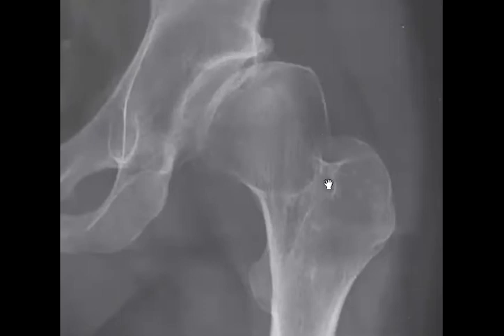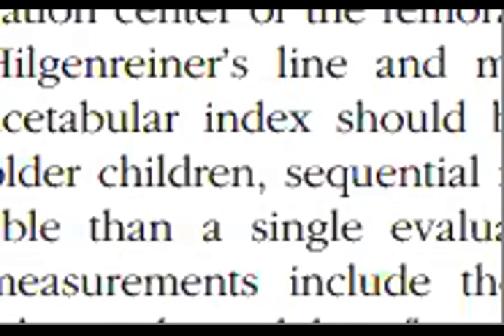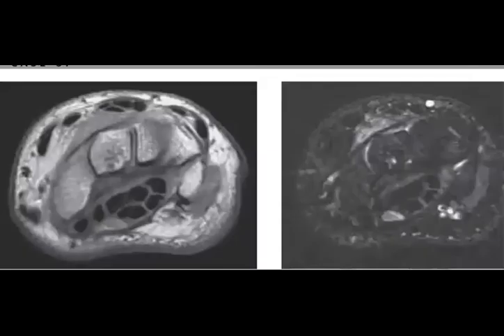And regarding the, yeah, I know it's not an easy one because this patient presented late and you can see the complication, but it is this one. It can present in a bit older age group with this appearance, okay? Let's have this case and then we can shift after to another.